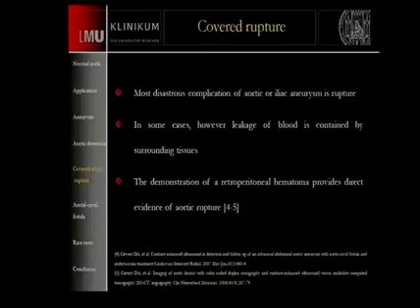Covered rupture is a very rare case. Therefore, it's very important to see maybe a hematoma or an active bleeding in this hematoma. But are we able to see these bleedings or not?